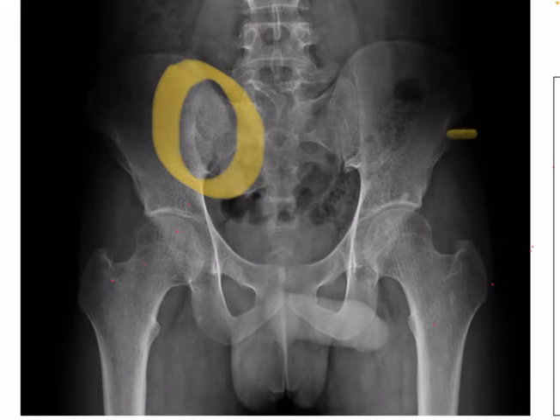If the person already has TB of the pulmonary system and now has a joint problem, then it may be secondary from the lung, or the microorganism may have entered directly into the blood circulation and from there reached here. So it depends, and your conclusion should be like this.